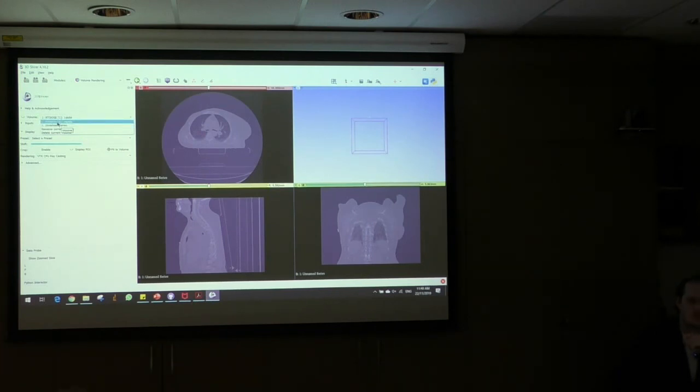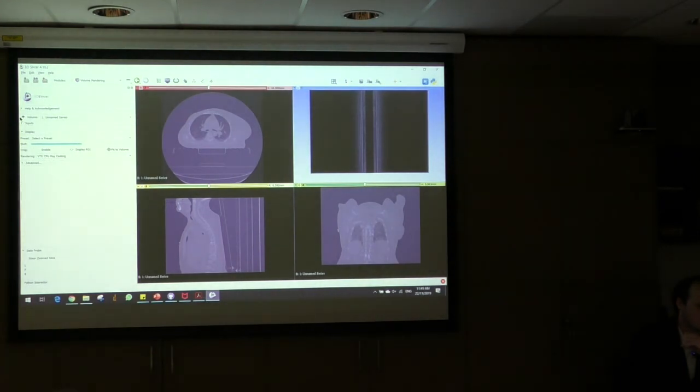The one above, RT dose, is the RT prescription dose that was based from the treatment planning software. So it's actually taken that information from the treatment planning software and put it into a separate file. But in this case, we will use the CT software. And we want to generate the volume of that by clicking the I symbol.